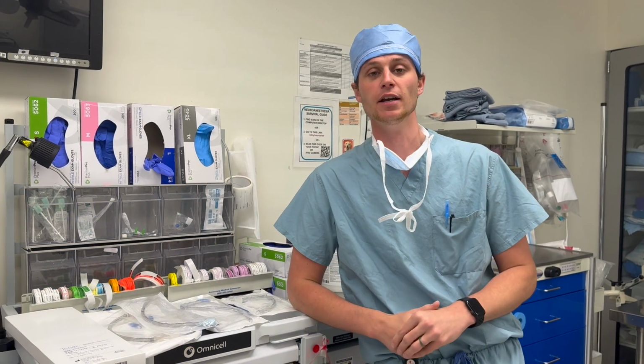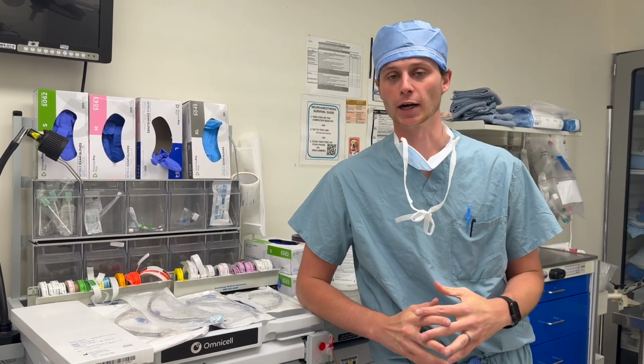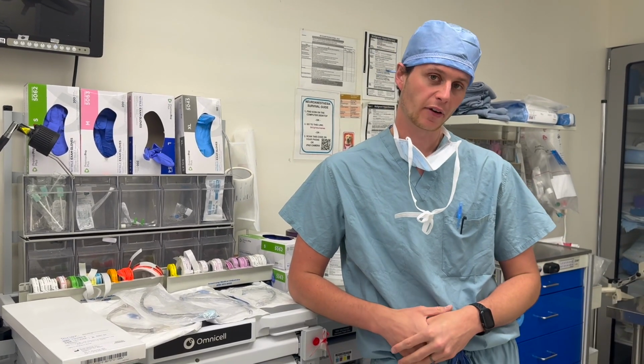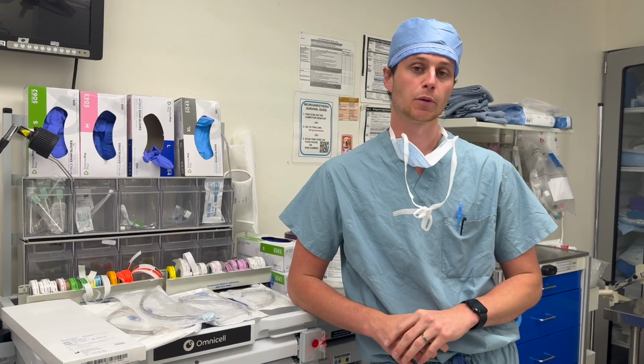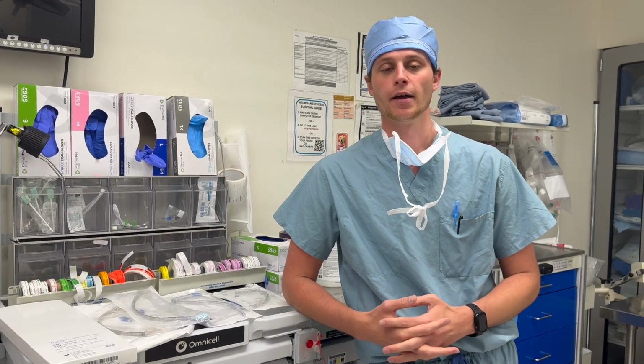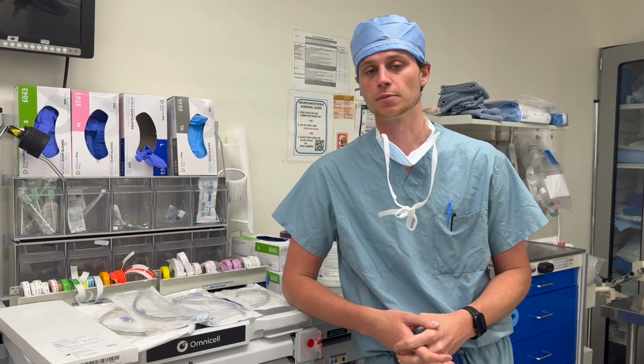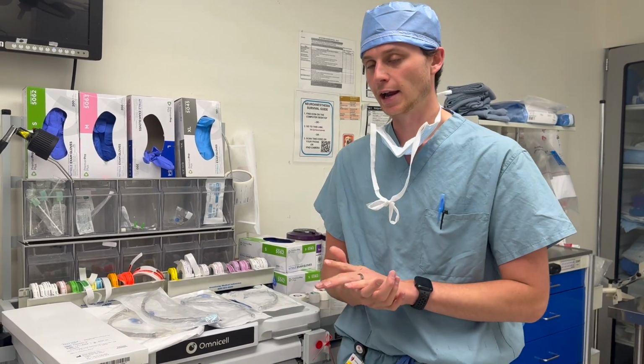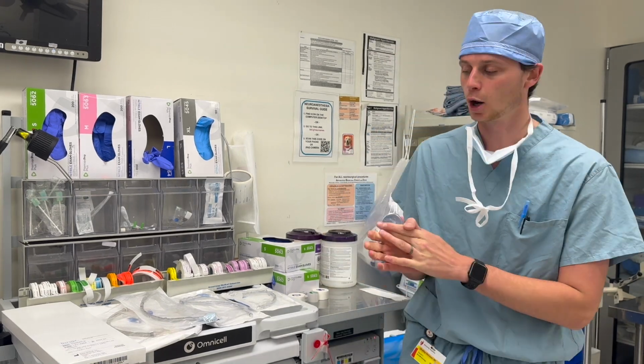As mentioned previously, on ENT you'll encounter a lot of abnormal airways. On this rotation, more than any, it's important to discuss with your attending the type of airway you are going to use, as well as discussing with the surgical team what type of airway they prefer. For a lot of the normal cases, you'll still use a smaller tube than normal, just to help stay out of their way. But I brought a couple different airways that we may commonly use in ENT over here.